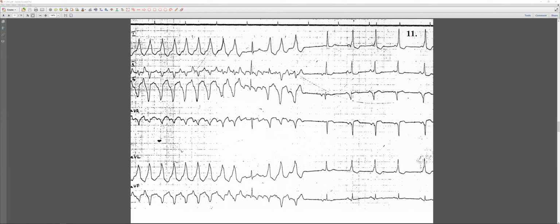And here, I guess this is a delta wave. Where? Right here. No, that's not a delta wave. Delta wave, you should use the... Yeah, I can see here a delta wave. Here, a delta wave.